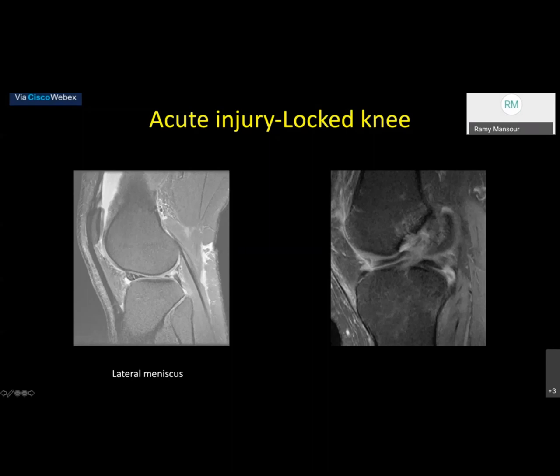If they are sitting very close to each other, they can produce what we call the pseudo hypertrophy sign, which actually represents a meniscal fragment sitting in front of the anterior horn. If you move slightly medially, you're going to see the rest of the meniscal fragment.